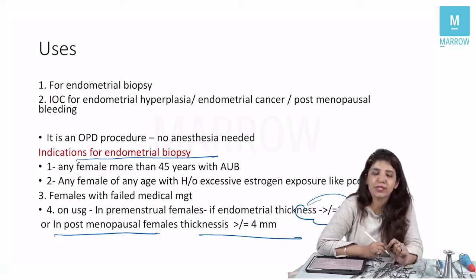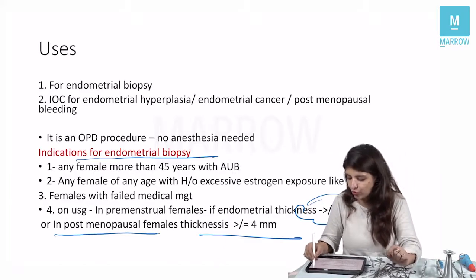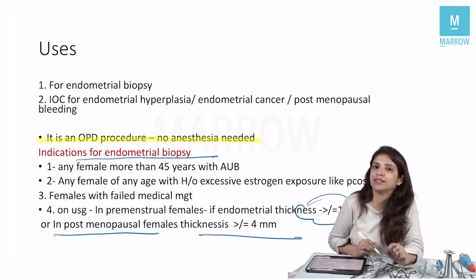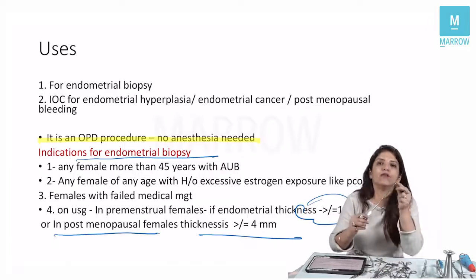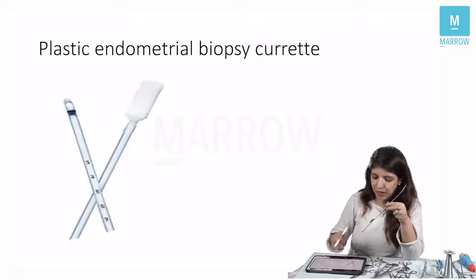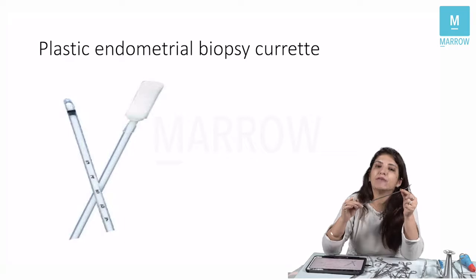Other important points about endometrial biopsy are that it is an OPD procedure and no anesthesia is needed for it. So it's an OPD procedure, no anesthesia needed. A very important instrument, the endometrial biopsy curette. This endometrial biopsy curette, which I have shown you, is a metal one.